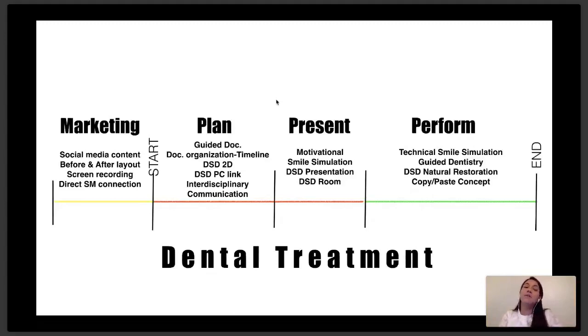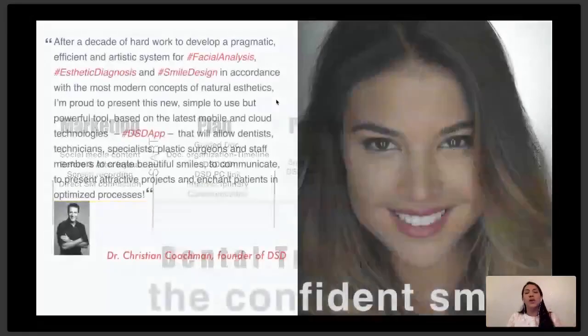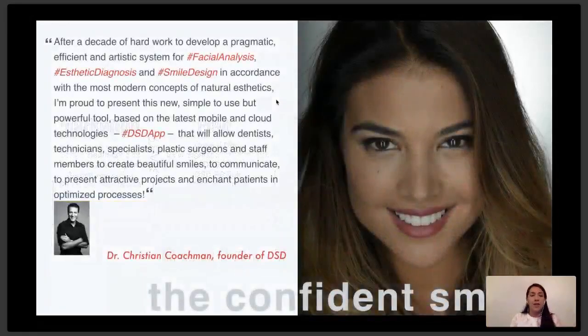Finally, it can help you deliver that confident smile to your patients by helping you create the 3D smile simulation and being able to export that and print out your models. So at the end, you can use the iPad version of the app from start to finish, at every point in the digital workflow, which is what we're trying to make you understand today.